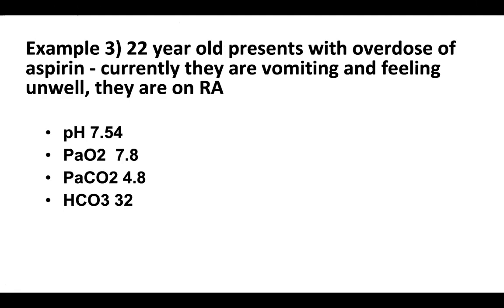So it's not a type 1 respiratory failure. The ABG results are useful by themselves, but without the clinical context, it's difficult to interpret. If we look at this, the patient has no oxygen requirements and they're on room air, so we don't think this is a respiratory issue. We think this is a metabolic issue because they've had an overdose of the tablet. Usually overdoses of salicylate will give you a metabolic alkalosis. Cool. Next one, it's the last one, guys.